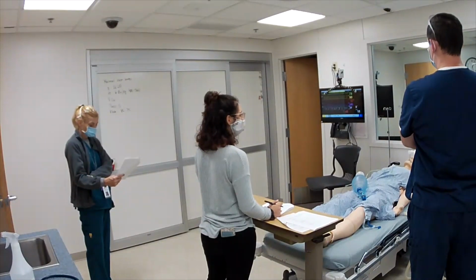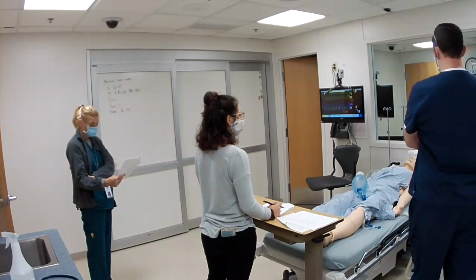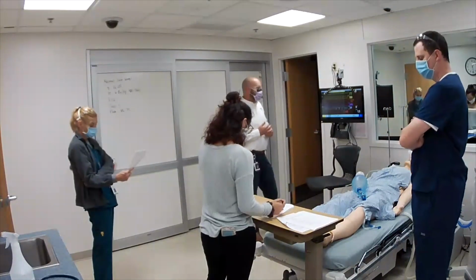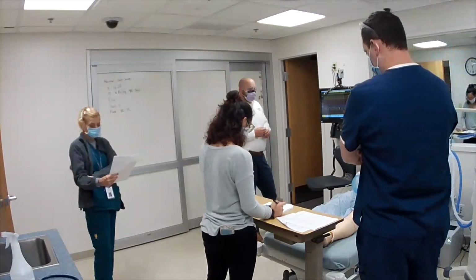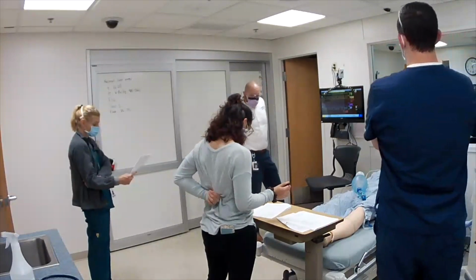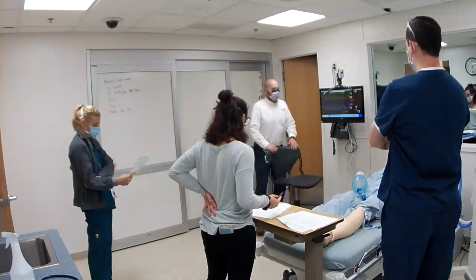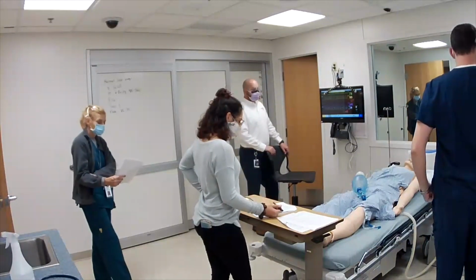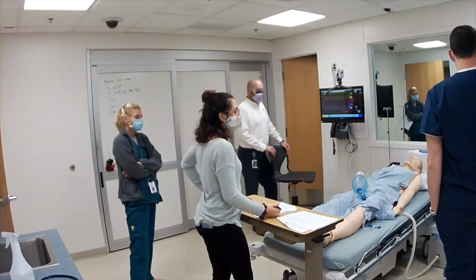Okay. So we got 3 waveforms there. Yellow, green, and blue. Tell me about our waveforms. Yellow is your pressure. Okay, so everything's yellow. So the vent's nice to us. It makes everything color coded for us, right? So tell me about our pressure waveform there. Pressure waveform is just initiation of breath, and we'll get a little bit of a bounce in between here. But initiation of breath and then end of breath back to our PEEP and then back up. Yep. So what about the green waveform?